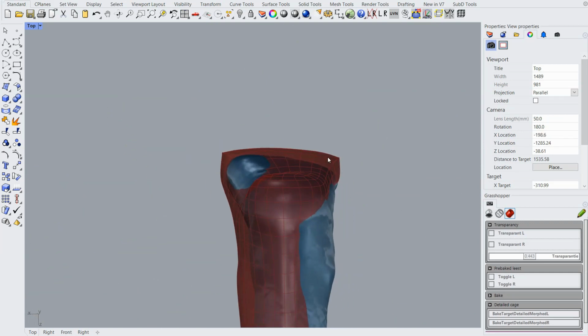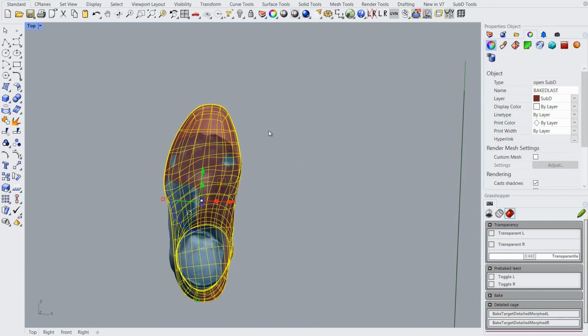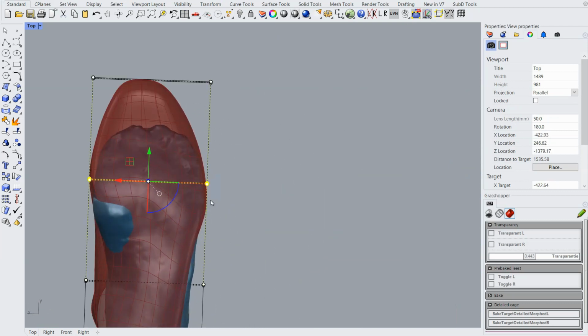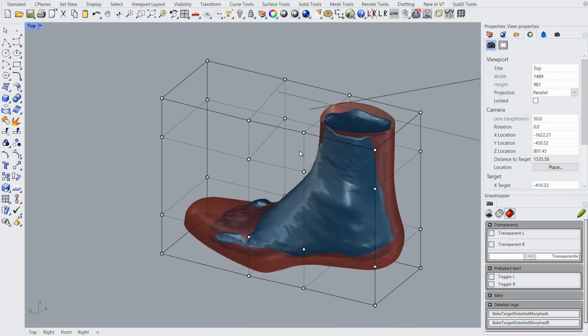I need more pronation here. The ball line is different. All kinds of differences that I cannot achieve by dragging this last in just the X, Y or Z direction. If I use a more complicated cage, but still a rectangular cage, I have more possibilities, but still it's not easy, and things tend to deform quite quickly into a shape I don't want. See, I already go wrong here, because this lump here, I don't want this lump there.